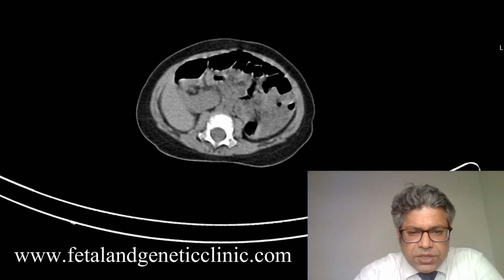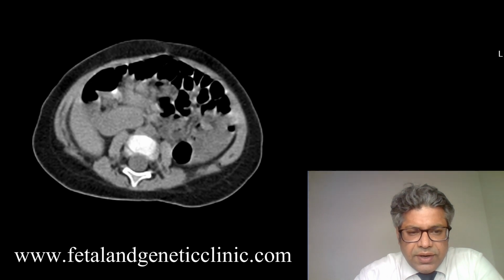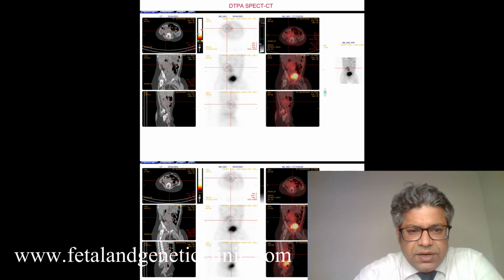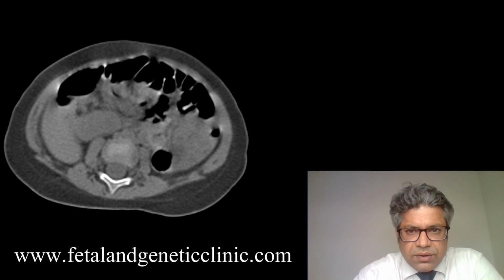Then this is the postnatal CT of this baby who was delivered, right? And then we can identify this small mass with a loss of CMD, corticomedullary differentiation. We then did a DTPA scan, and identified that both the kidneys were there and they were functioning. This is that DTPA scan, in which we could delineate both the kidneys. They are anterior, but not outrightly ectopic. This is the similar CT in the postnatal period, but the complaint is of a decreased GFR, right?